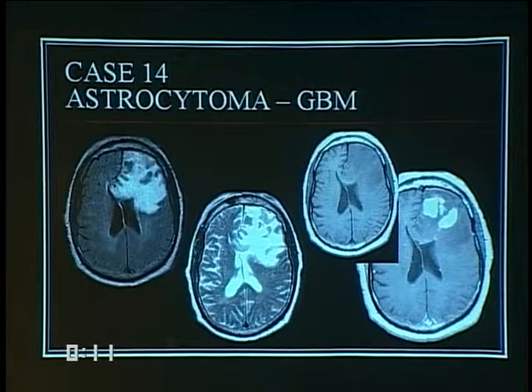This is a glioblastoma multiforme. It's coming across the midline, not too much abnormal signal in the right cerebral hemisphere as yet.